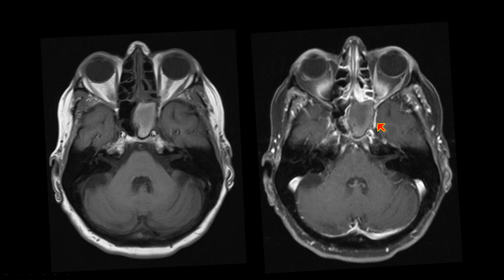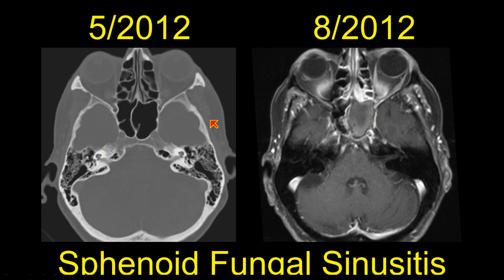And unfortunately, we sent our surgeons to operate on basically a fungal mycotic aneurysm that was in the cavernous sinus on this patient. And to make it worse, if they had paid attention, that sinus was actually normally aerated just a few months beforehand, before this patient got that fungal disease. So unfortunately, in this case, we blew off this fungal disease and said it was likely incidental sphenoid sinus disease. So the sinuses can be very important, and we can get some very exciting disease very quickly from the sinuses. So don't ignore the sinuses in our studies.